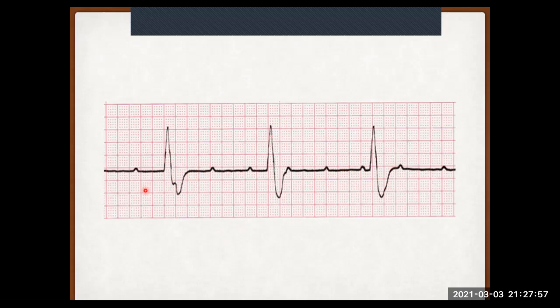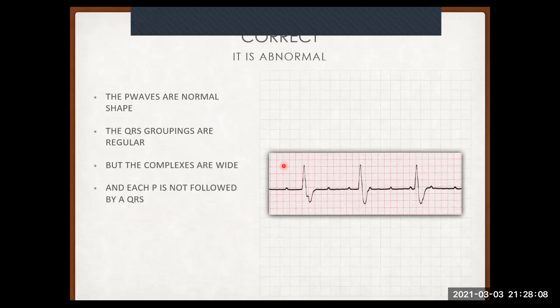Okay. So if you've never seen a complete heart block or third degree heart block, this is a third degree heart block. And now you know why they call it third degree. Okay. Very good. Let's try another one. So this is just going through what we were talking about. Okay. So we're not going to dwell on that for too long.